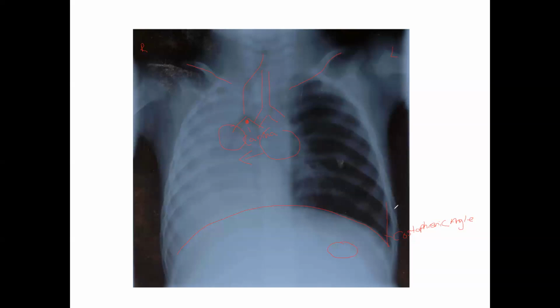So those are some things that we'll look at and think about moving forward. But we'll move on to the next chest x-ray. With this chest x-ray, hopefully you can see you've got the tracheal deviation, as well as the atelectasis, increase in radiopacity on the right side. And hopefully you can see those changes that are made there. Go ahead and clear that. We'll move on to the next slide.